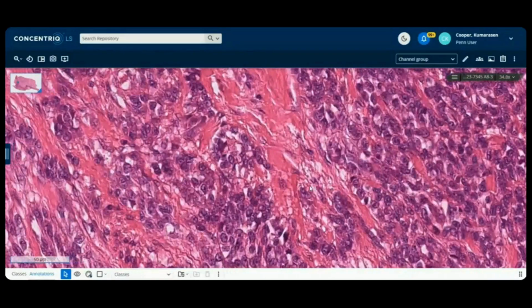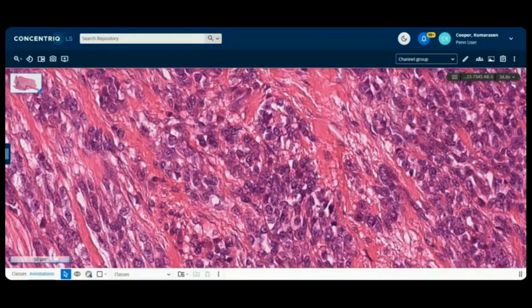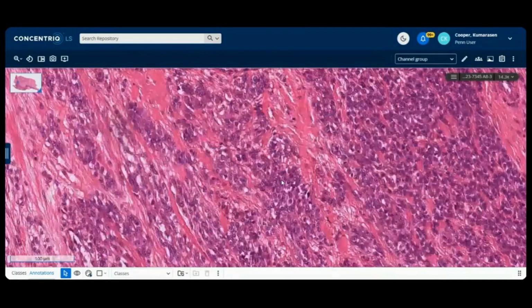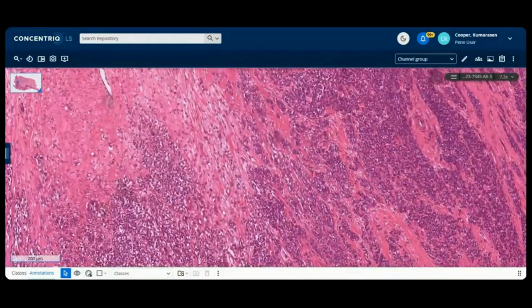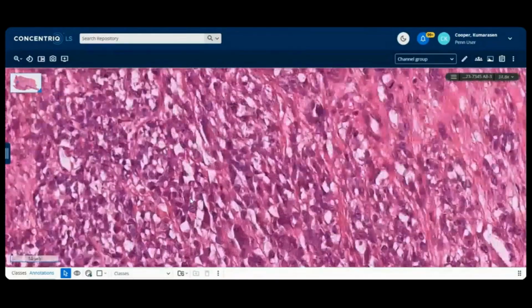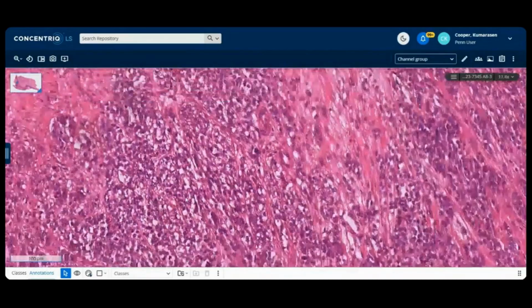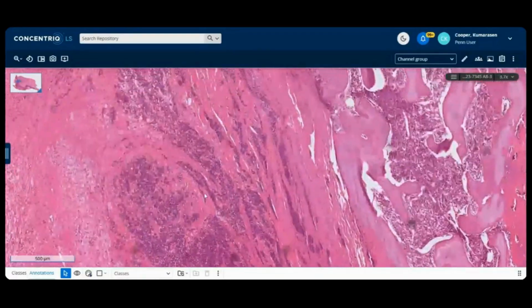more often than not, I see that in clear cell sarcoma, they look a little more pink rather than truly clear. Dr. Enzinger described this, I don't know, 40, 50 years ago as a soft tissue melanoma, malignant melanoma of soft parts. And that's a clue that the melanoma markers are going to be positive. And here, you may argue there's some clearing. I didn't see this first time around, but probably best that I did not see it, because it looks vacuolated and artifactual rather than really truly clear.